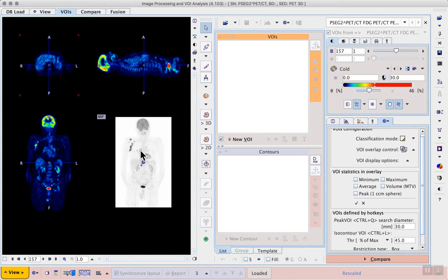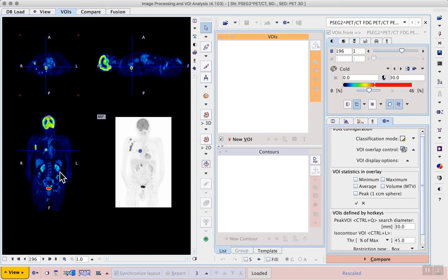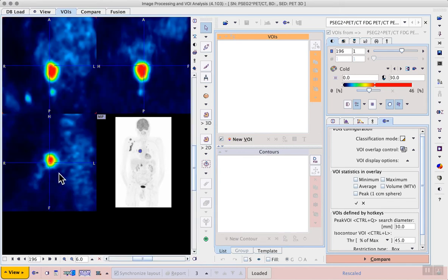So we can click on the MIP image in this large tumour near the heart. This triangulates that tumour in the image display, and then we can zoom in using the controls at the bottom of the image display to see that lesion more clearly. Notice that the MIP does not zoom, so it continues its function as a navigator even once we've zoomed in to the image itself.